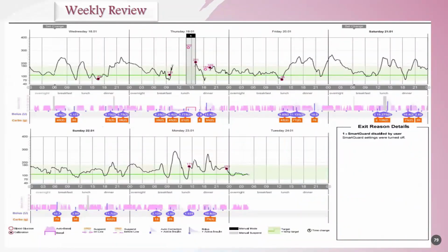Okay, and the weekly review, as I said, will give you a quick picture about how he's doing. It shows you here this icon, he changed the set. So 1, 2, 3, change the setting, and it shows you brightly the target blood sugar which was set by the pump. He used 100, and it shows you the graph of blood sugars, what happened during daytime.